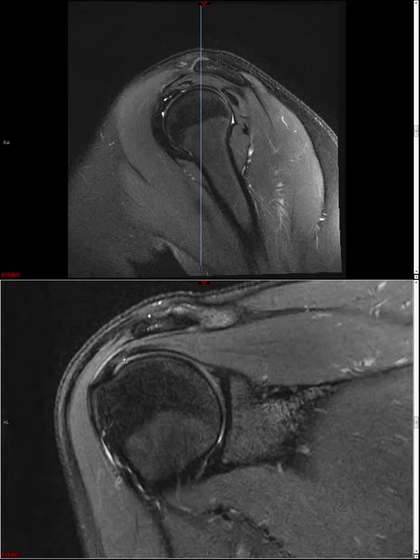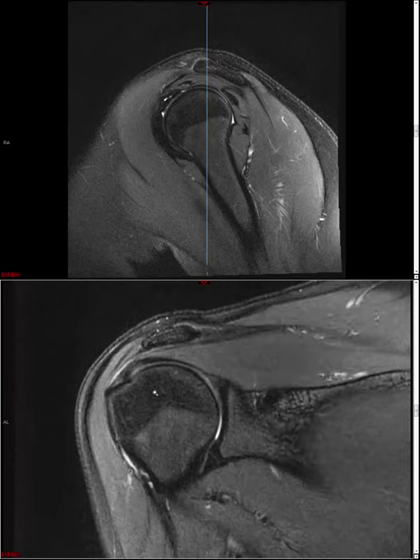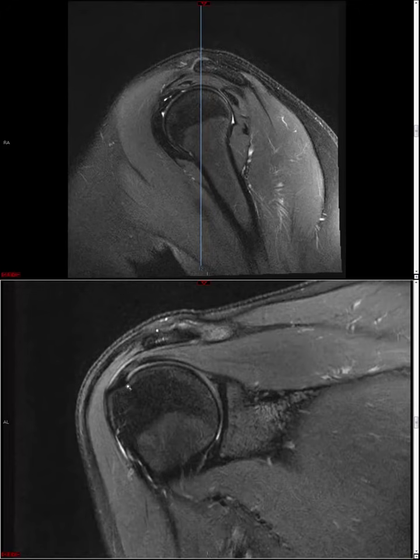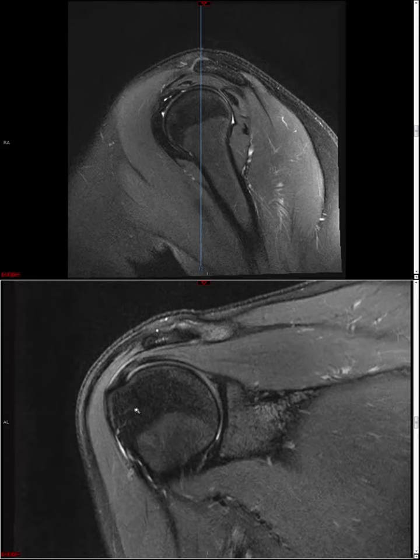If you have a T2 fat saturated sequence, it's helpful to look at that because you shouldn't have magic angle artifact on a long TE sequence such as a T2. Okay, for now we'll just kind of consider this a real finding. When you see gray signal within the rotator cuff, but not quite fluid signal, then generally we would call that tendinosis. If you see fluid signal, signal that's, say, as bright as this trace of fluid in the bicipital groove, then we would start calling that a tear.